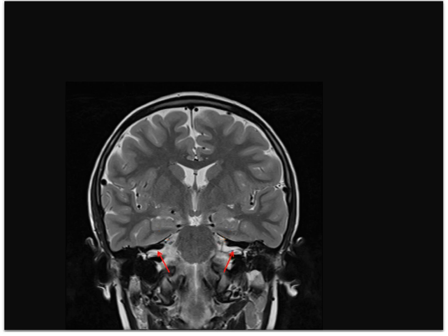Internal auditory canals conduct the facial nerve, or seventh nerve, that gives motor innervation to the face, and the vestibulocochlear nerve, the eighth nerve, that mediates hearing and balance. The circles indicate the semicircular canals and vestibule. Why are the vestibule and semicircular canals bright on this T2 weighted image?